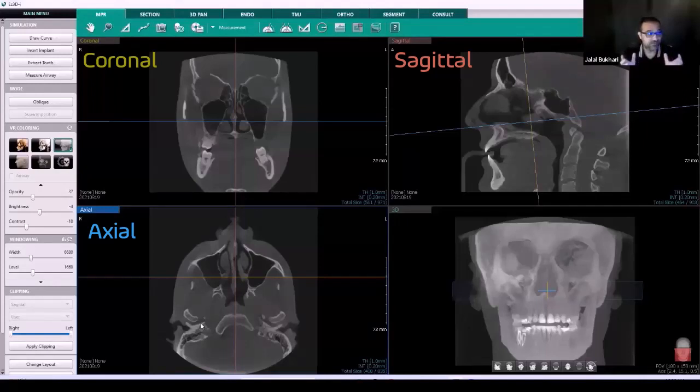If it's not oriented, it won't help us rule out a true asymmetry, such as cases of hyperplasia or hypoplasia. So if one condyle is truly larger than the other due to a pathology, we won't be able to truly notice that on a scan unless it's properly oriented.